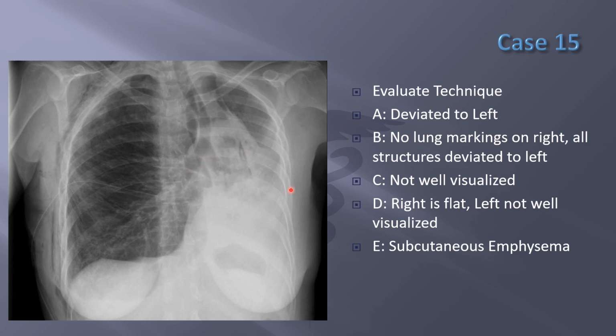Lung markings over here. Now if you notice, it's kind of streaky. It's not that wispy, kind of branch looking lung markings that we saw before. So there's a lot of streaking here. On the left side I don't really know what to make of this. It looks denser, thicker. This is all just real consolidated. I don't really see anything. That would be normal.